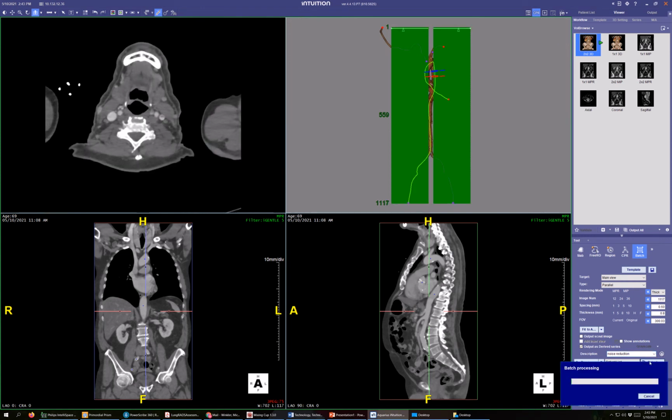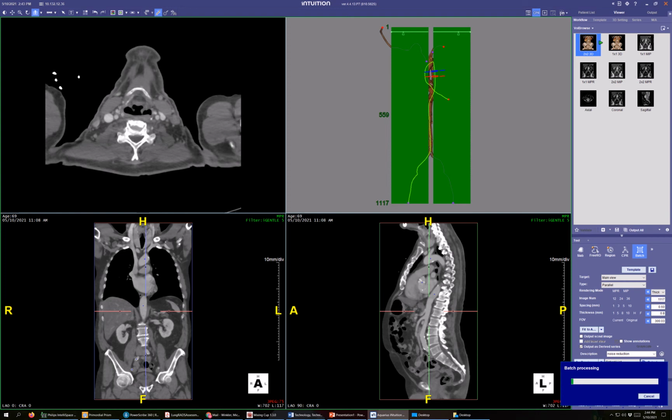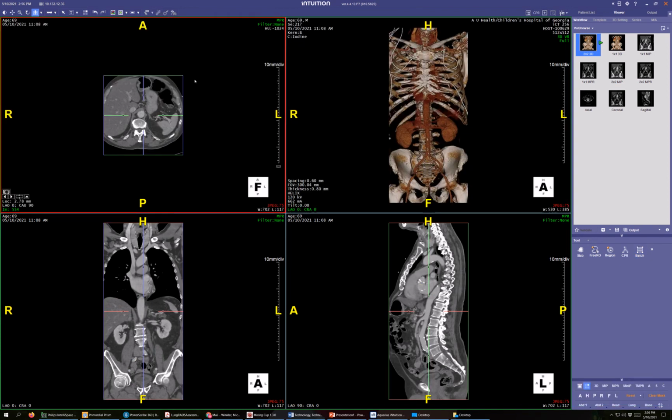As soon as it's done and I have the data reloaded, I'm going to pause here, and then once it's done, I'll start again. It's just to stay HIPAA compliant too, because I have to go back to the main list. Okay, we're back now with some rudimentary noise reduction.